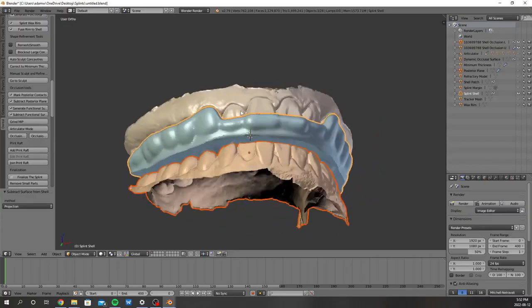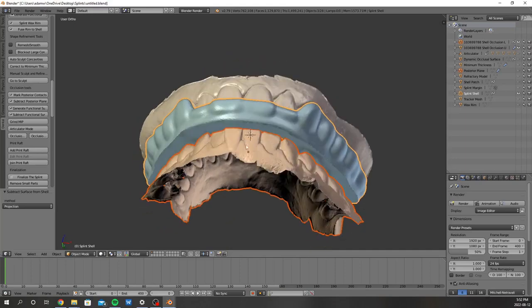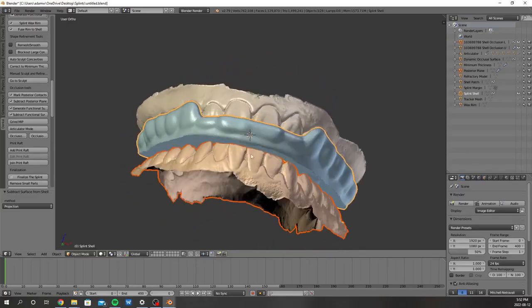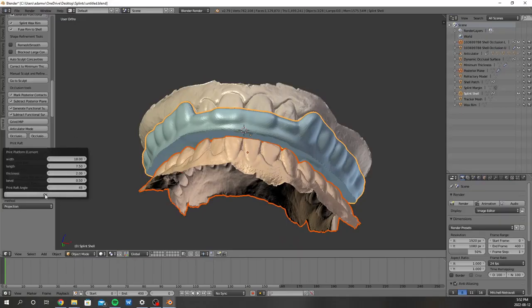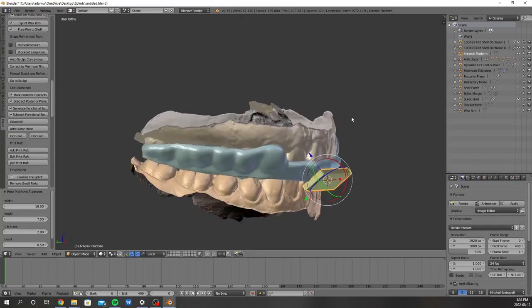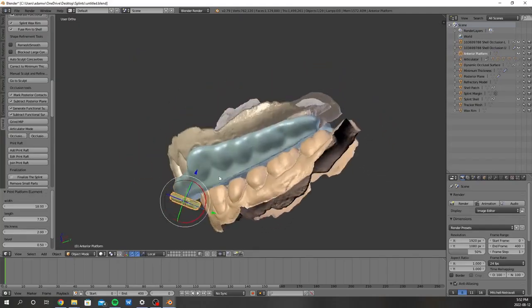So that's pretty much it. The only thing that we're gonna do to make this thing easier to print, so that we don't need a bunch of supports and stuff, I'm gonna come to the front of the splint, right where it's almost like a 90-degree here. And I'm gonna click it, and it moves that little cursor there. And then I'm gonna hit add print raft. This is fine. You just hit OK, and it gives you this. So this is just something that helps us print the splint. So we add it on there.